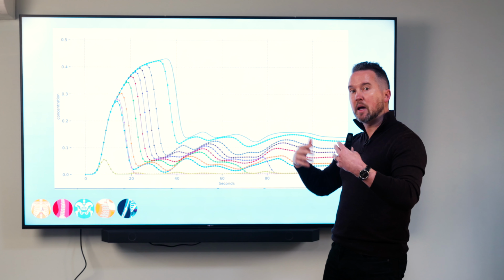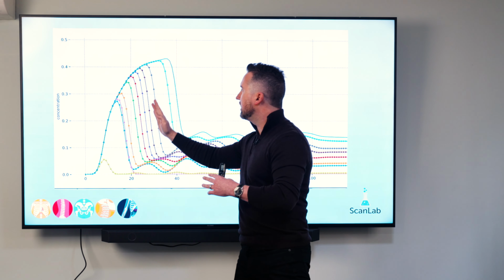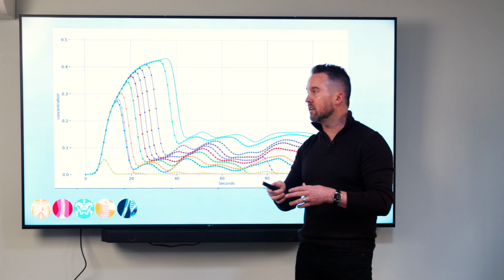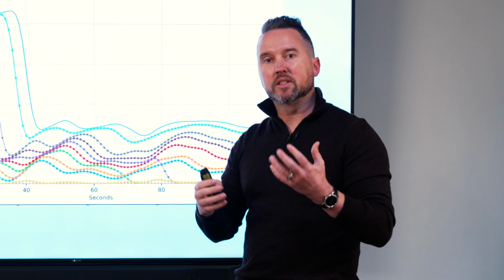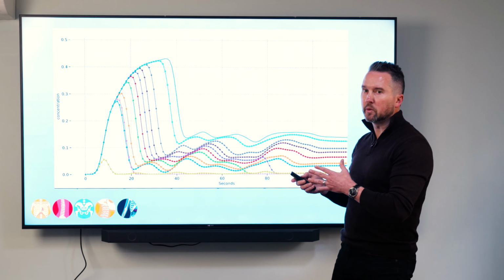So in this case, this is a patient with a single stroke volume, but with different volumes of contrast that we've given for the exact same flow rate. So you can see if this would be a test bolus or a test injection, these would be 10, 20, 30, the contrast duration could be 10, 20, 30 seconds of contrast that's washing in. And obviously if we have a larger amount of volume, it's going to take longer for that to move into my heart and out into my vasculature. So we knew we were on the right track.